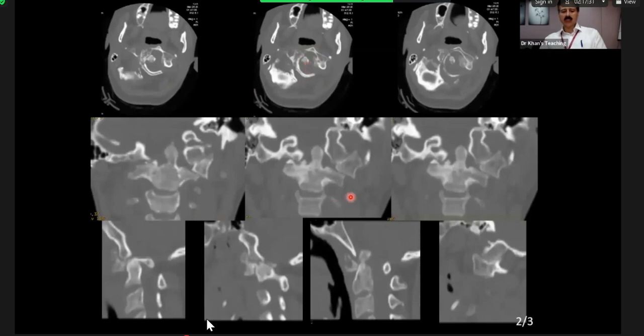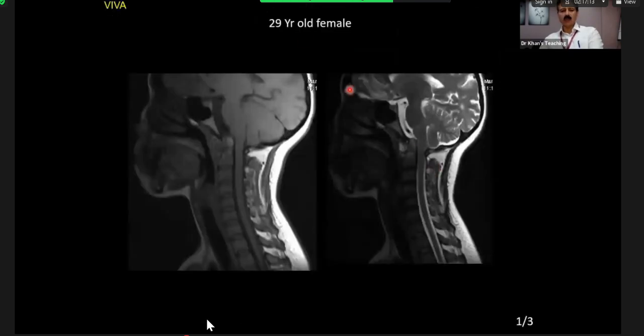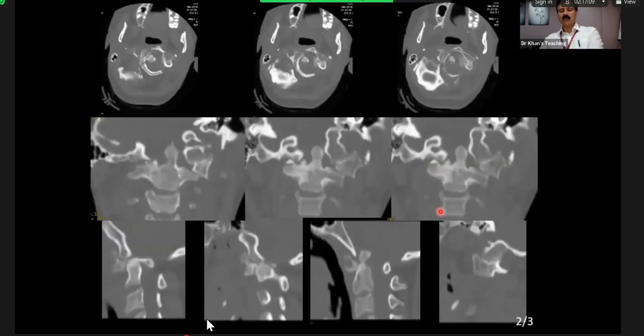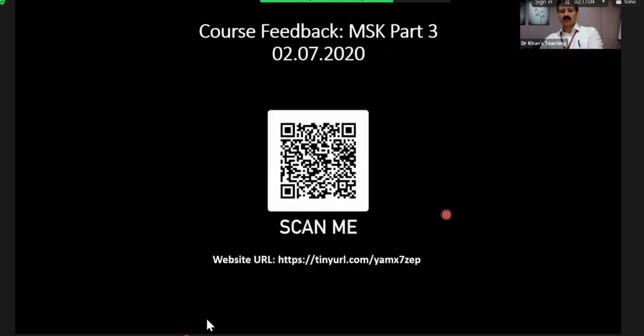And if you see these, now you can understand what has happened in this case. Look at the lateral mass. This lateral mass has also subluxed. But on this side, there is no lateral mass. It is all destroyed. So it is a similar finding to the RA finding, even more blatant. And this patient was only 29 years old, and this is TB arthritis, which has caused this.